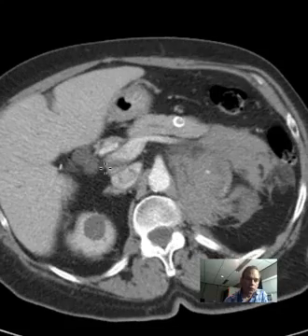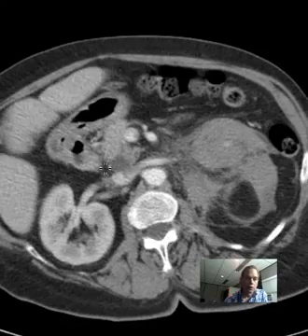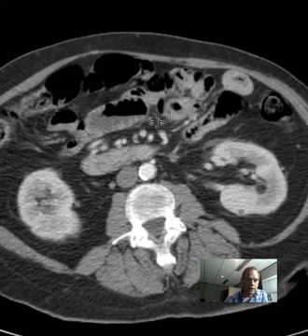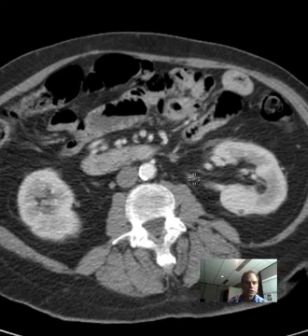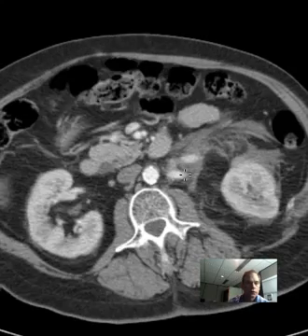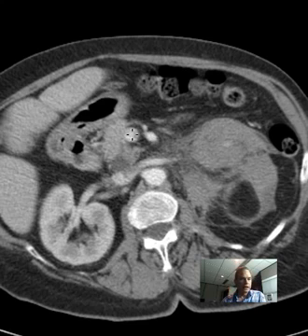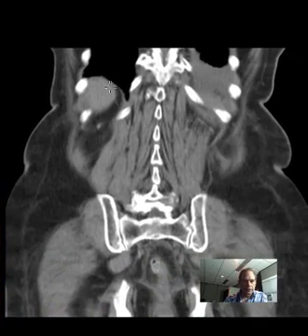What else goes there? Well, the portal vein has to go there. Where is it coming from? From the mesentery and the bowel. So if we go out to the bowel here in the mesentery, and you see all this mess, and you don't know what to make of it because it just looks like all these lines and squiggles and stuff, go back upward to the root of the mesentery. Right here around the pancreatic head, you'll see the superior mesenteric artery and the superior mesenteric vein. Now the superior mesenteric artery is the one that comes out just inferior to the celiac artery. Let's see if I can get that in here.